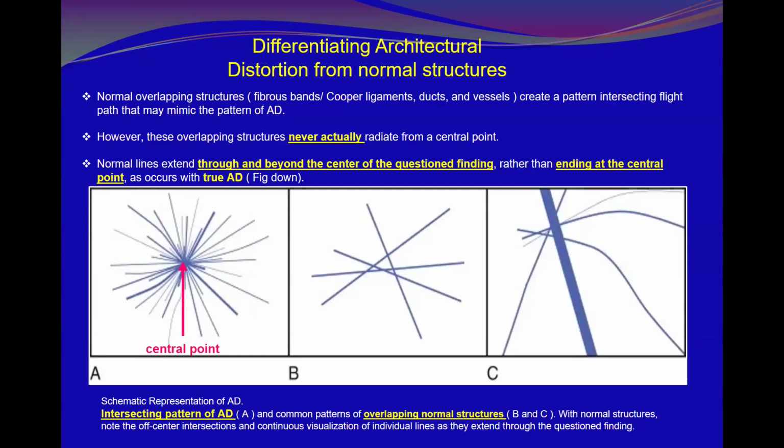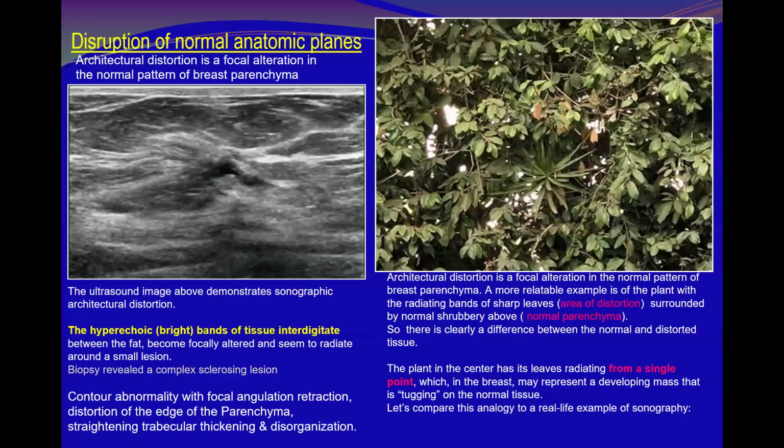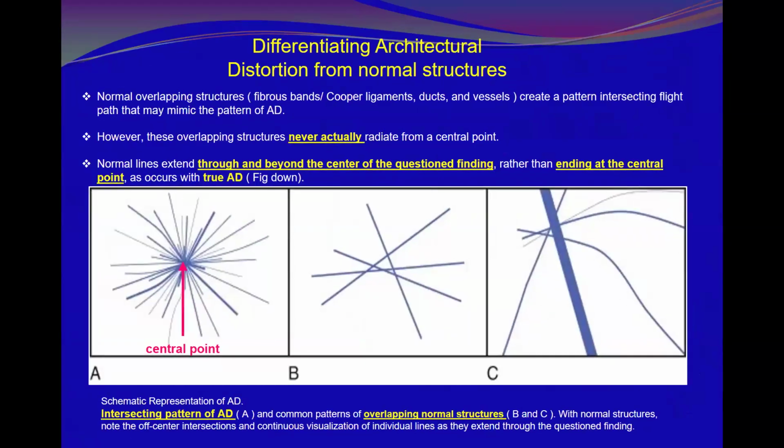This illustration is more applicable in mammogram, but can still work here in case of ultrasound. Let us see the illustration.